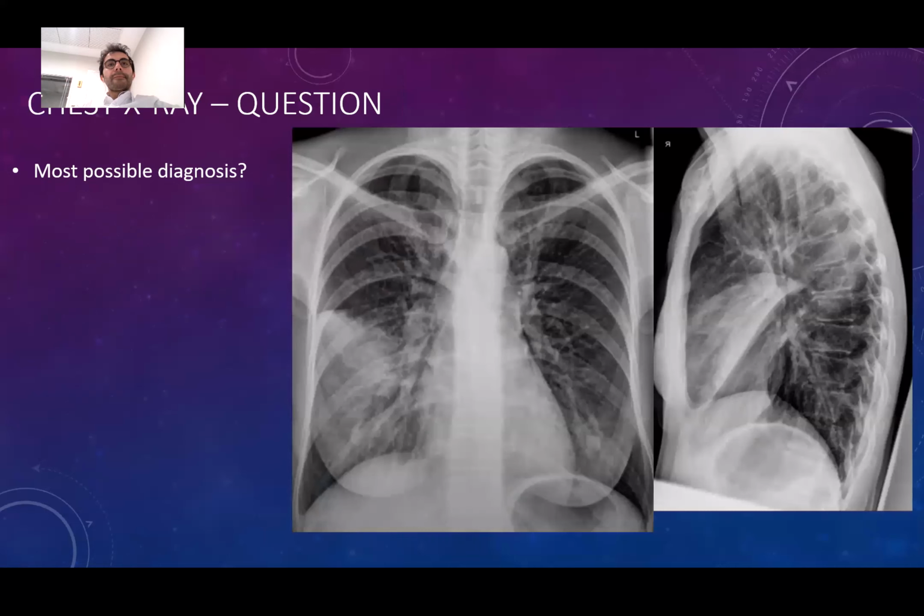All right. Thanks. So look at this one, Al Zehra. What do you see? I see the bronchovascular is more dense. Yeah, true, good observation. Bronchovascular markings are pretty prominent on this patient.